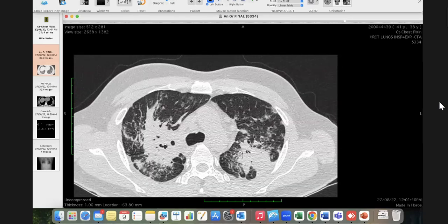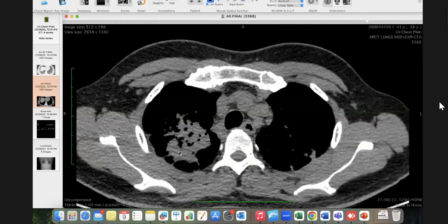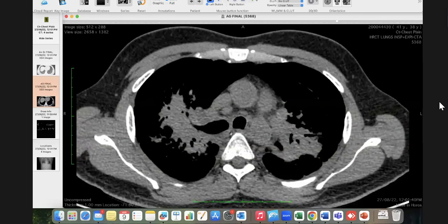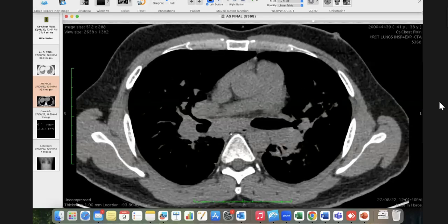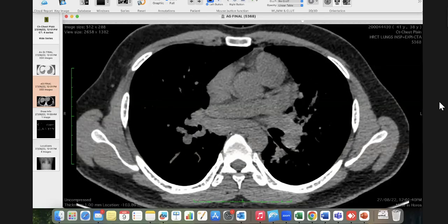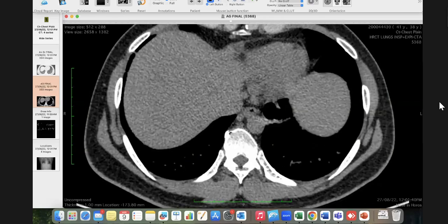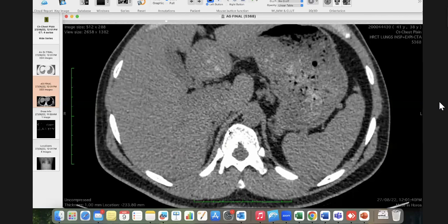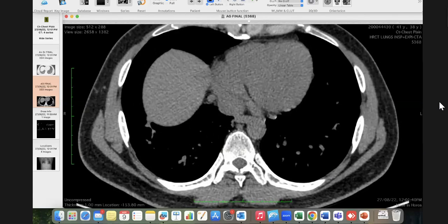Let us have a look at the lung window. I don't even remember. Yeah, but there are lots and lots of lymph nodes. See, confluent lymph nodes, bulky, no calcification. This is also a classic sarcoid. So be mindful of sarcoidosis. Never forget sarcoid. Whenever you see a chest CT, never forget sarcoidosis. In India, you cannot afford to forget tuberculosis, but add sarcoid to that list as well.